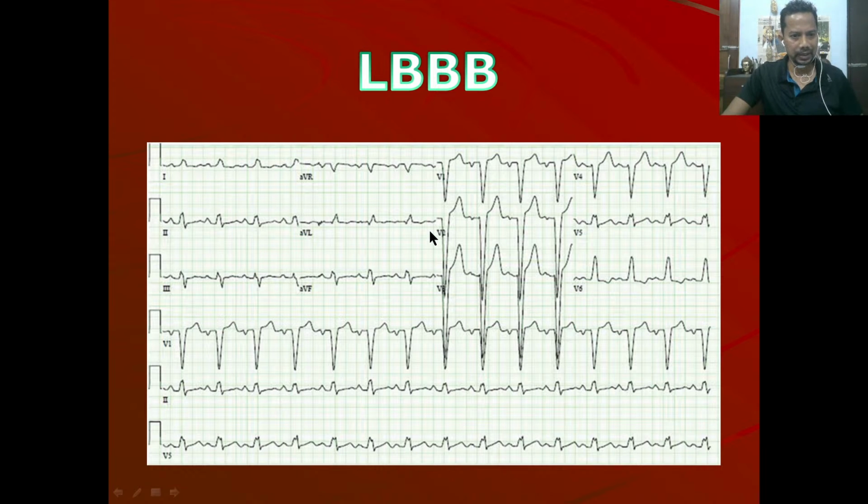Now something interesting you are seeing out here. P wave is tall. Okay, but more than tall, it is broad. It is almost the size of the R wave in width. Just make a mental note of that. Then after looking at P wave in lead 2, you look in V1 where the right atrial and the left atrial components are divided.